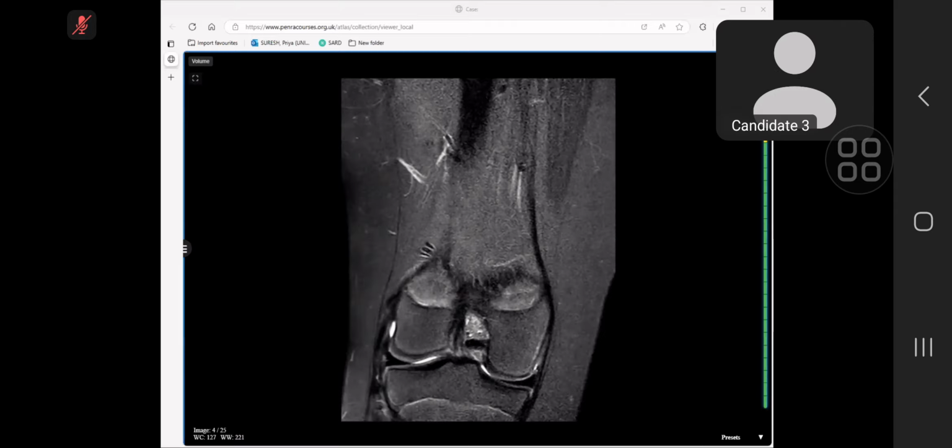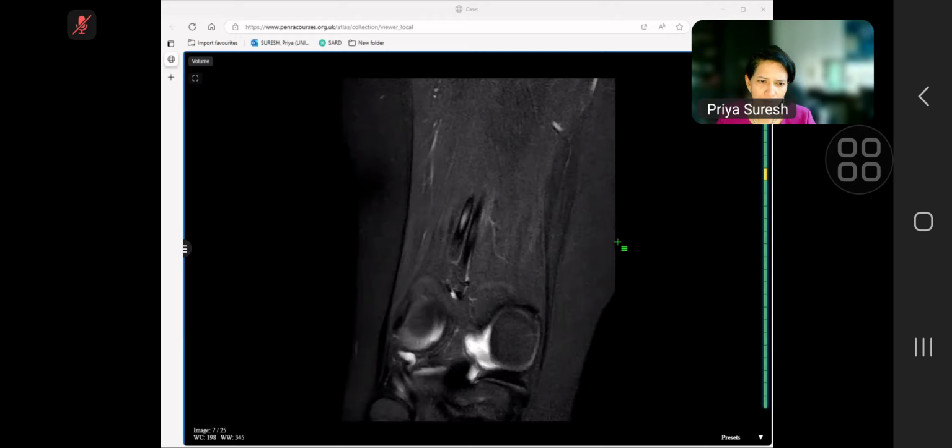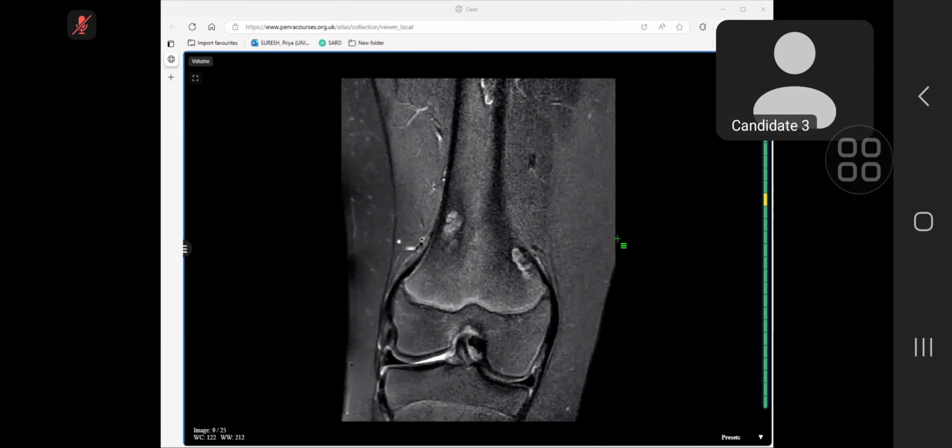So this is the STIR MR images of the same patient. I can see the two lesions, which I already described on the X-ray, and these are heterogeneously hyperintense with lobulated margins noted in the lower medial condyle of the right femur, and having narrow zone of transition without any periosteal reaction or cortical break. So I will stick with the diagnosis of non-ossifying fibroma as my first differential.